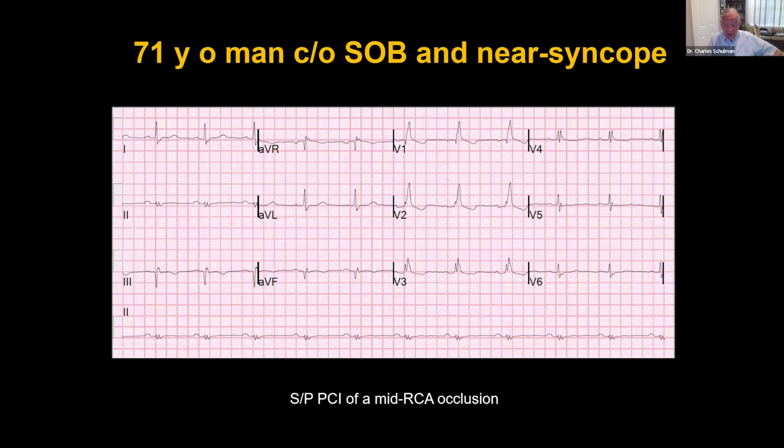A stent was placed in his mid coronary artery, treating a right coronary occlusion, and he now has sinus rhythm.